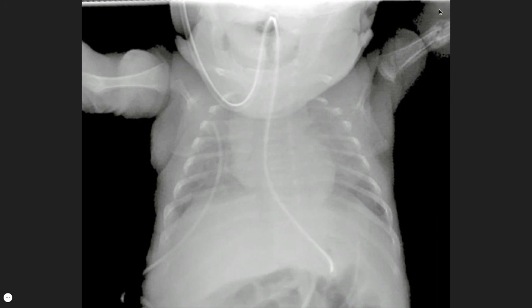Checking the bones reveals a healing fracture of the left mid-humerus with periosteal reaction. This is not an acute fracture, as periosteal reaction doesn't typically occur until 7 to 10 days, and the appearances raise the possibility of non-accidental injury.